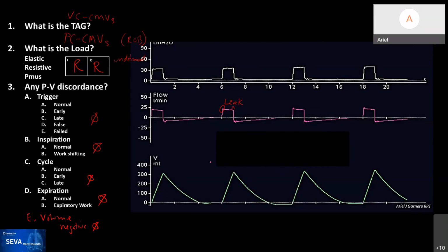And in the expiratory part, there was an increased expiratory resistance. And what people said about the tag, keep a look on the level of the pressure and you're going to have the secret. So far, the only thing I can tell is that it is a pressure control breath composed of mandatory breaths only so far. That's correct. Yeah, excellent.